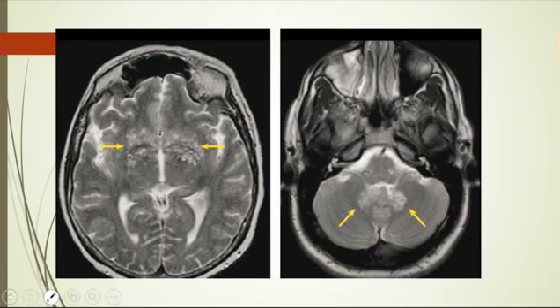What do we have here? This is a very characteristic appearance for a very characteristic disease.